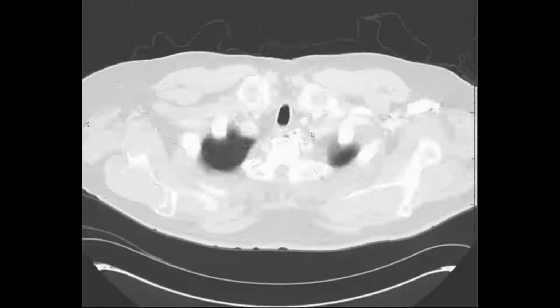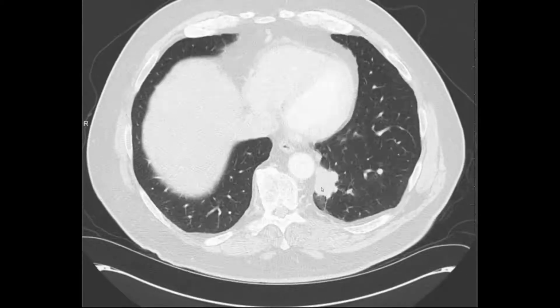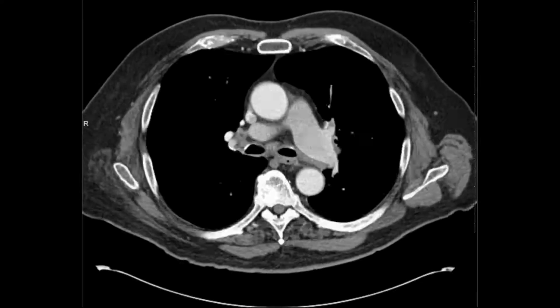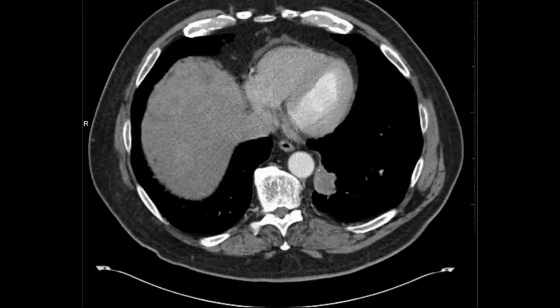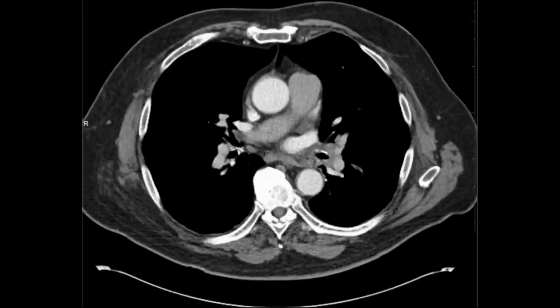Okay, let's look at our second case of lung adenocarcinoma. What I'm seeing here is I'm going down and I see this kind of perihilar or perimediastinal mass that has a long interface between the lesion itself and the mediastinum. And it looks like it's really just directly extending into the mediastinum. And so that's going to put it in a different category other than just size.